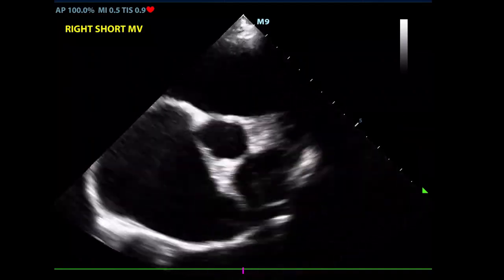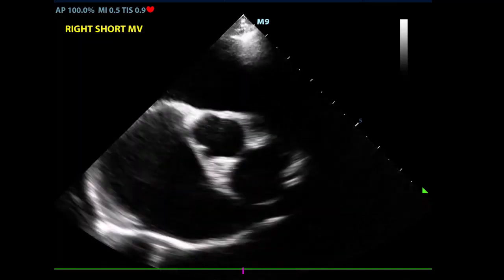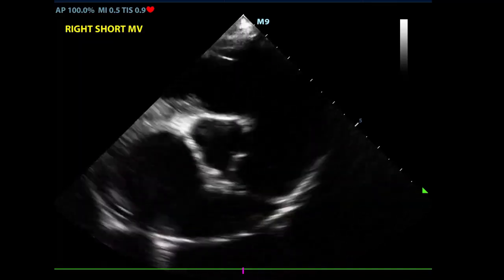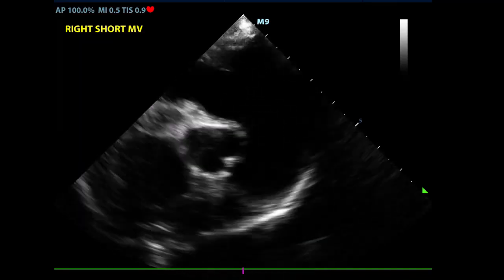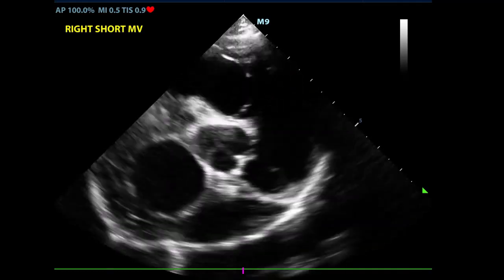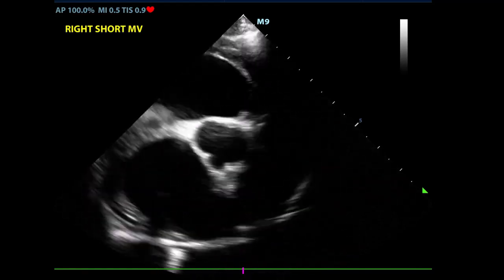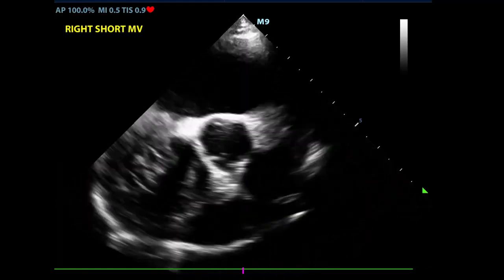I make subjective observations. What do I see? What does it mean? You should be asking yourself the same questions. The purpose of making objective measurements is to support or refute my initial observations.